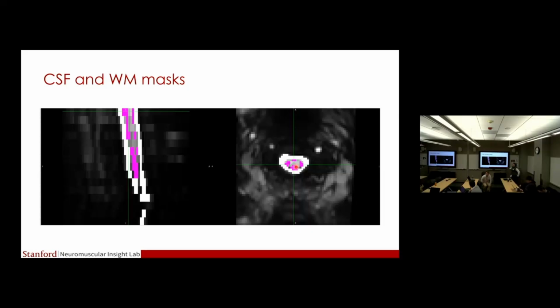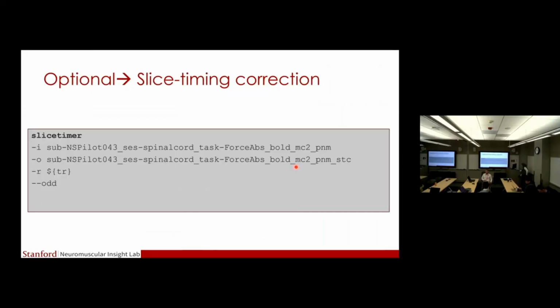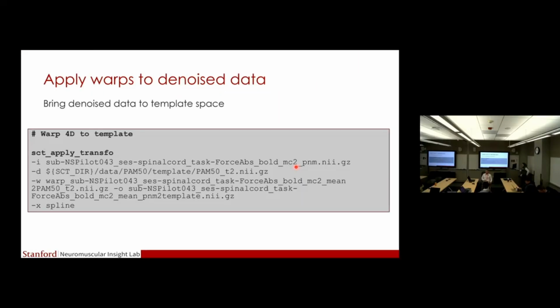So that's one, and the other point is, there was a follow-up question: why are you doing the analysis in the template space as opposed to, I'm talking about first analysis? Yeah, first level. Why wouldn't that be done in the native space in order to avoid introducing those interpolations? Yeah, so that's a controversial thing. We do the analysis in template space because we want to smooth a straightened cord. Now, if you're suggesting not to do smoothing, well, yeah, then that might be something you don't need to do.